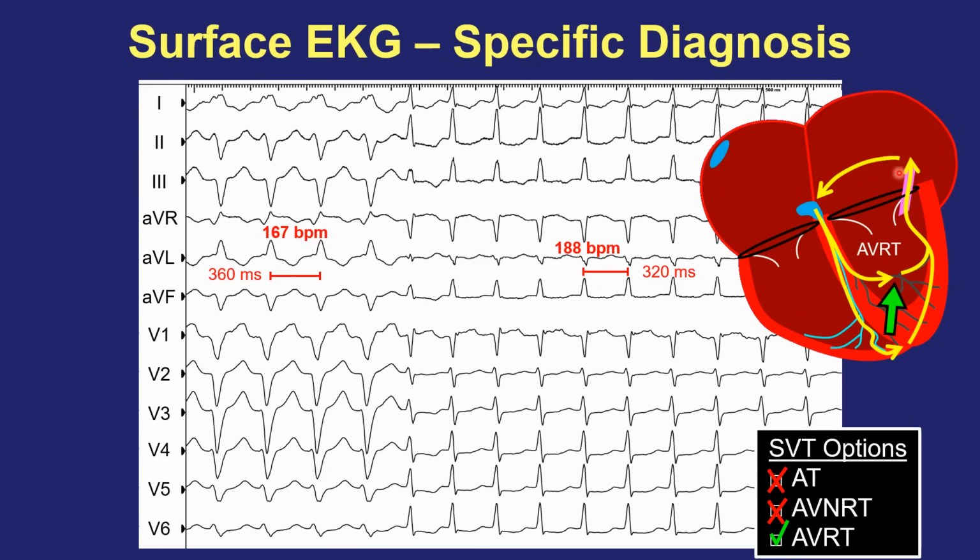So you may not see as dramatic, or in fact maybe not any, cycle length change when you have the disappearance of a bundle branch block or the appearance of a bundle branch block. In that latter category, it took longer now to get from V to A, and then you hit the AV node later, and it may conduct better because you have less decrement in the reverse direction.